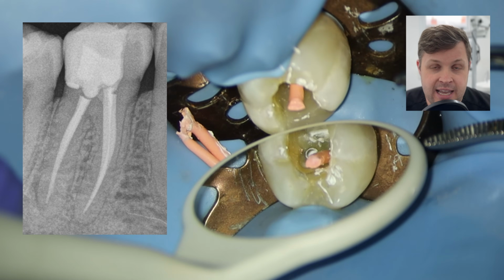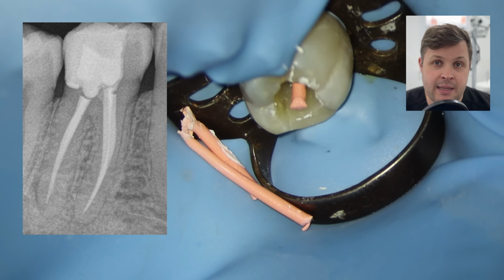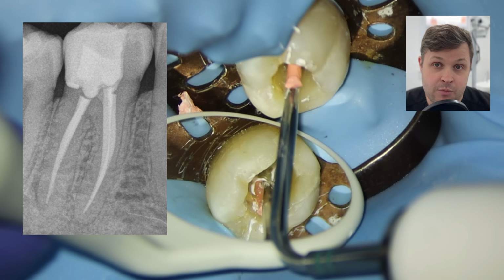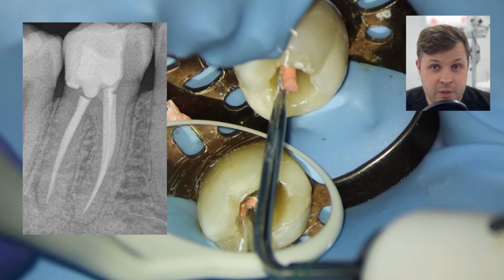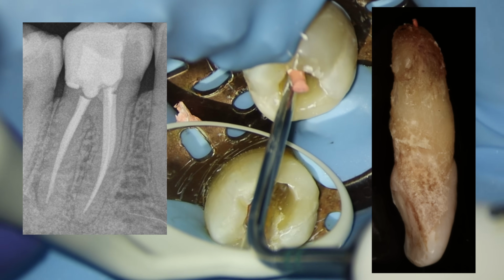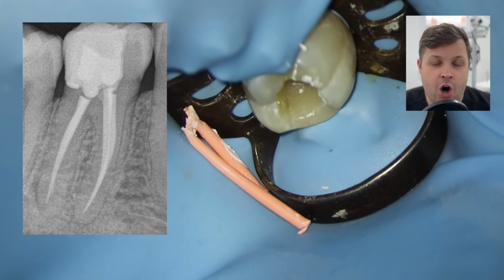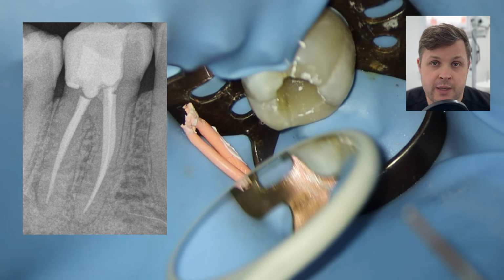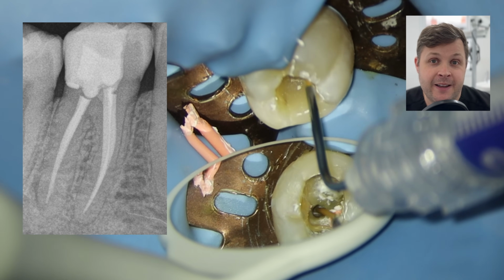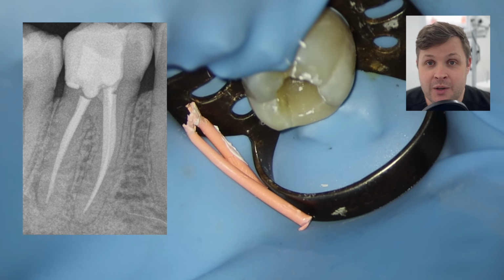I think this isn't all the way to the radiographic apex, but as I have mentioned before many times, it's not something that you really want to do, because as we mentioned before with this picture here, you can see that it's out the end. So I think the take-home lesson today is to, on balance, trust your apex locator over your x-ray, although it's really important that you use your apex locator in conjunction with your radiographs.